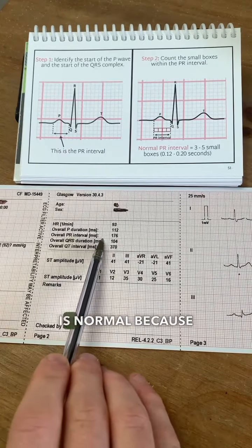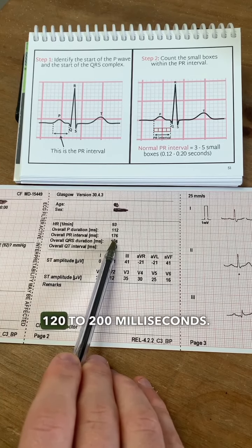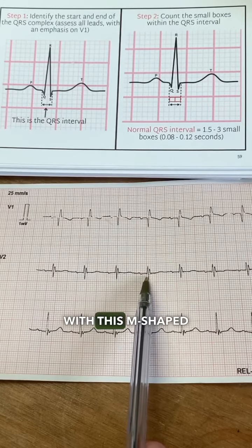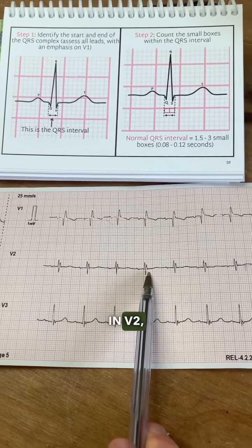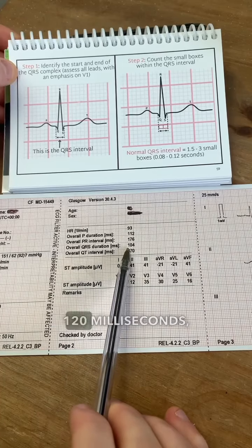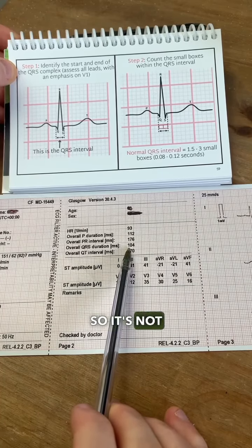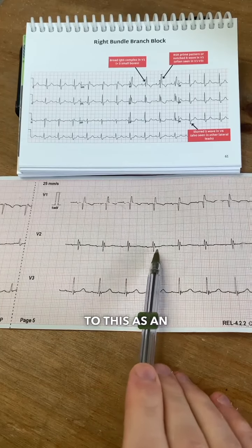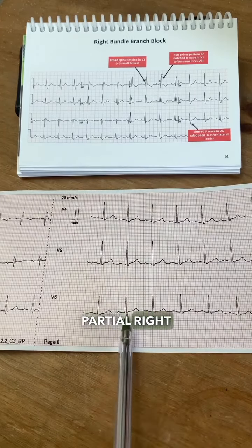The PR interval is normal because it's between 120 to 200 milliseconds, and the QRS width looks, actually with this M-shaped QRS complex in V2, it looks a little right bundle branch blocky, but the interval is less than 120 milliseconds, so it's not quite wide enough for it to be a complete block. So I'd refer to this as an incomplete or partial right bundle branch block.